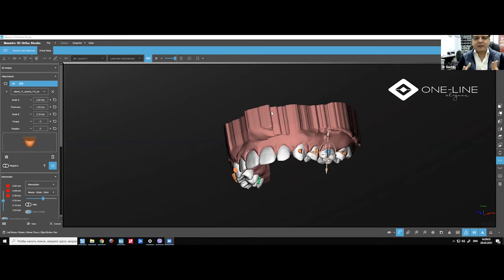We should understand that you have more surface area on the posterior and less surface area on the anterior. So we have more intrusion on the posterior. That is also one of the cases where we have open bites. So we have to compensate for that open bite by anterior movements, so the final touch will be the same. They will not change. Or you add attachments on the posterior teeth, which will keep the aligner in place with no intrusion effect. I'll just try to show you one of those cases.